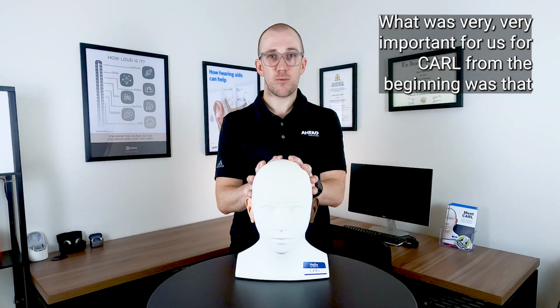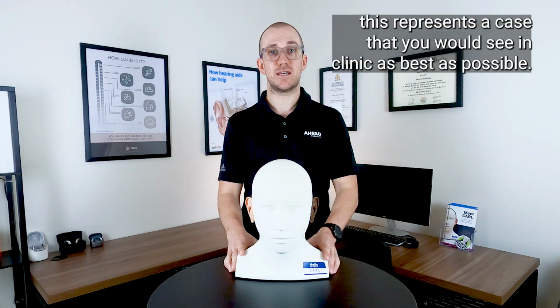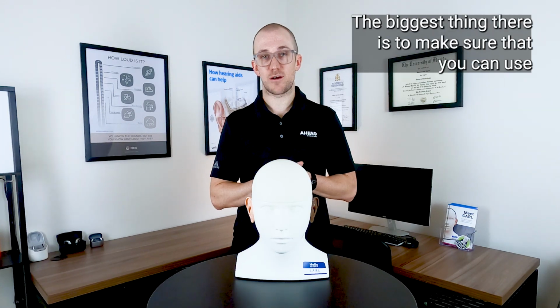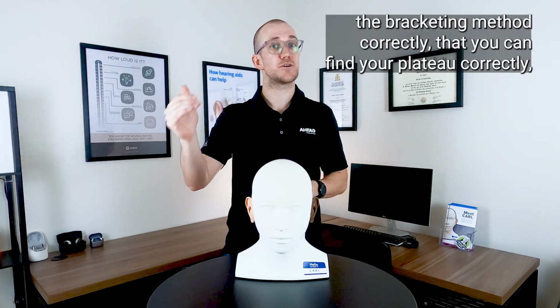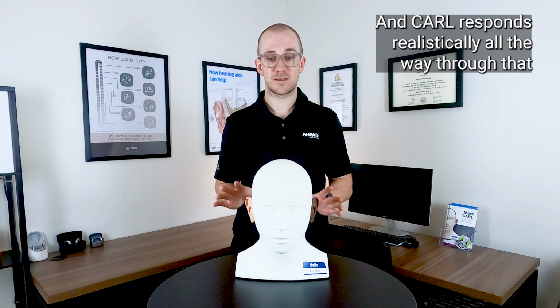What was very important for us for Carl from the beginning was that this represents a case that you would see in clinic as best as possible. The biggest thing there is to make sure that you can use the bracketing method correctly, that you can find your plateau correctly, and Carl responds realistically all the way through that.